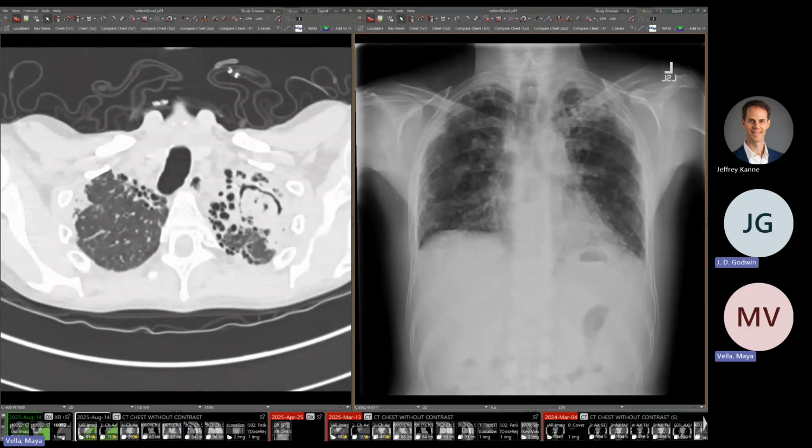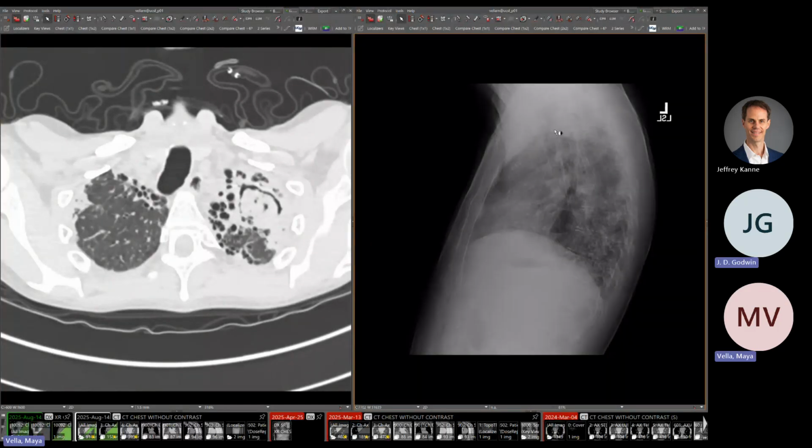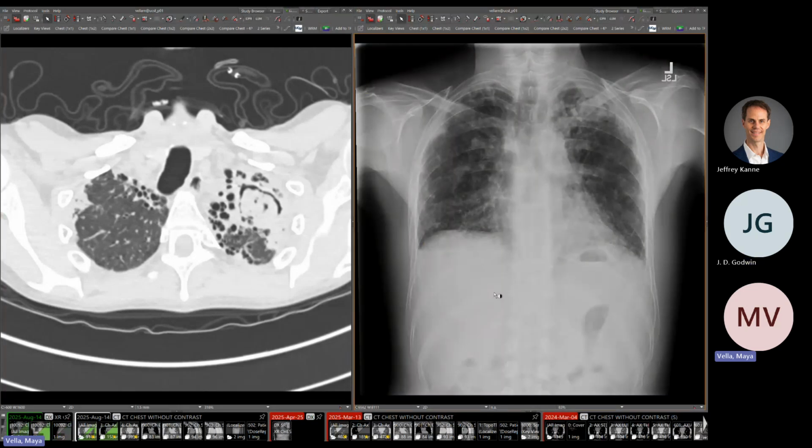So yeah, there's a big debate around here about what to call this. Oh, yeah. So you want to get into this air crescent sign? I agree. I honestly don't use either of those terms because I think it's so confusing. I just tend to be descriptive, but this was a known mycetoma. They've been trying to treat it. So I probably would have just said mycetoma, honestly.